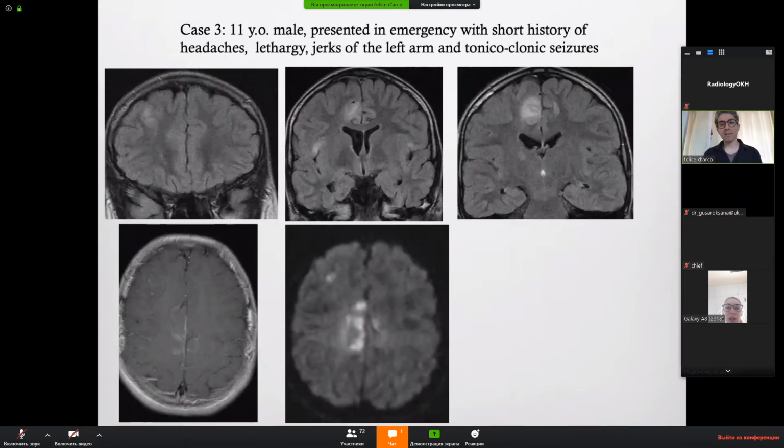Let's see this other thing. Again, remember, you can have a bit of patchy restriction, and sometimes also hemorrhagic degeneration. But it's not all restricting, it's not all enhancing, it's not an ischemia. Apart from this parechovirus that I show you, where the diffusion is much more florid.